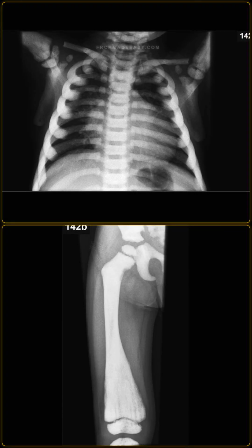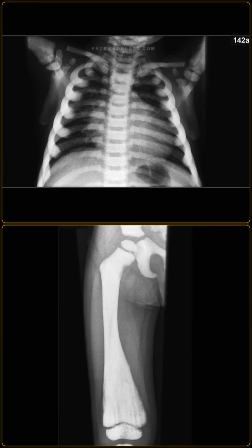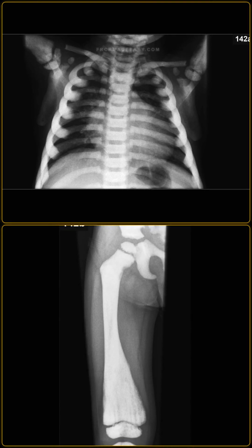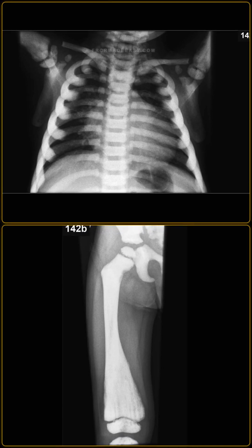As a radiologist, I would recommend a complete skeletal survey to confirm diffuse involvement and refer the patient to pediatric hematology and genetics. I would also recommend baseline brain MRI or CT to evaluate the skull base for potential cranial nerve compression.